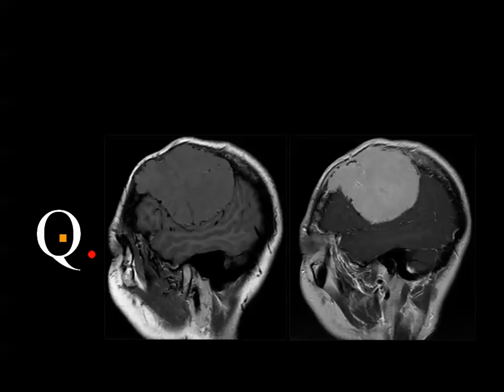Sagittal MRI, T1 and T1 post contrast. Large, homogeneously enhancing lesion destroying the bone with extracranial extension.